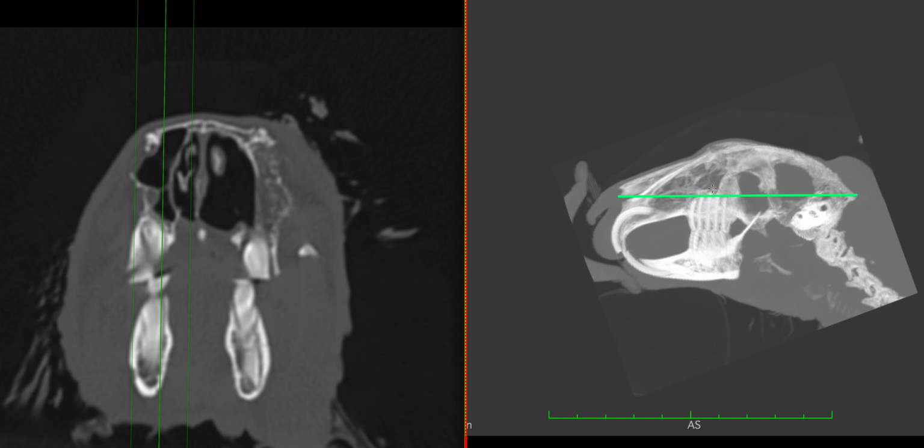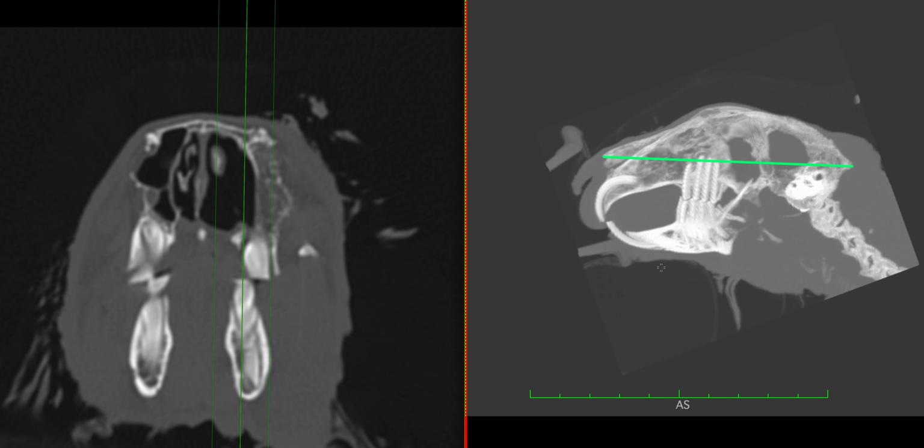There is a couple of reserve crowns which are minimally extending dorsal to the reference line. So on the right side there is a very mild overgrowth, and on the left side similarly there is one for sure, and the second one probably slightly overgrown with respect to the normal.